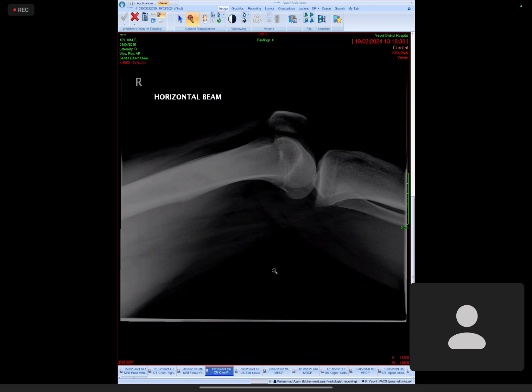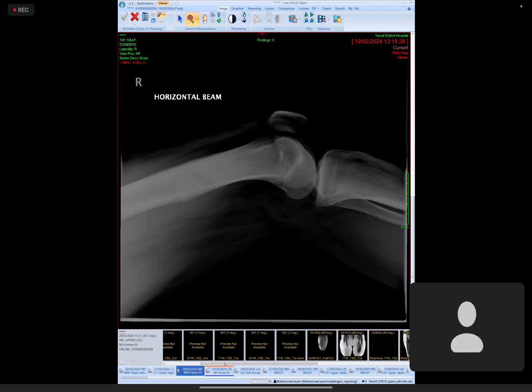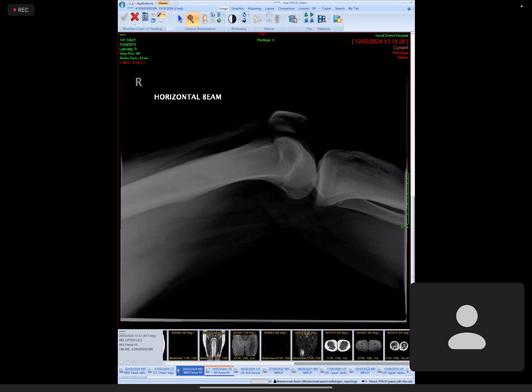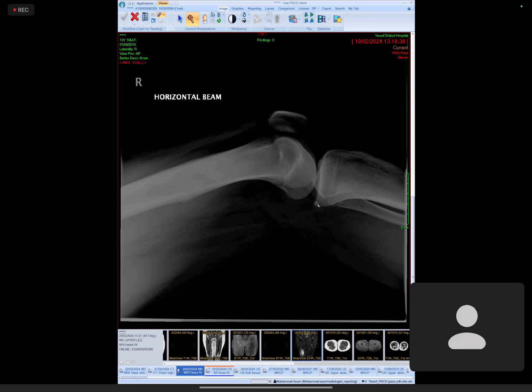I'll open up the patient's previous notes and look for raised inflammatory markers to rule out osteomyelitis, and I would carry this case forward with an MRI of the femur. Which sequence would you like to have? Sir, I think I'll go where the money is. I want to look at the contrast enhanced, fat saturated image. If I don't have that, then a STIR image would be very helpful, sir.